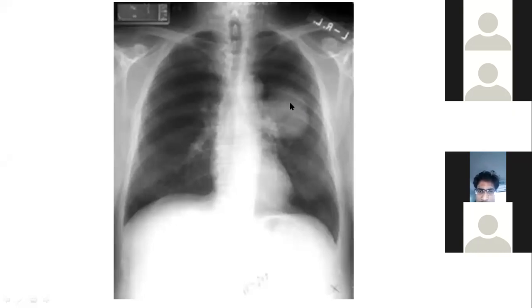It will appear like indenting the mediastinum, but it will form acute angles, like this particular mass is doing. And a mediastinal mass will form obtuse angles. So a broad base towards the mediastinum will be a mediastinal mass, and anything that has acute angles with the mediastinum will be a lung mass. That will be the basic essence.